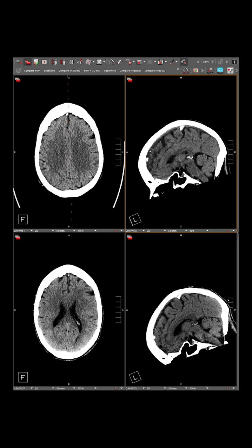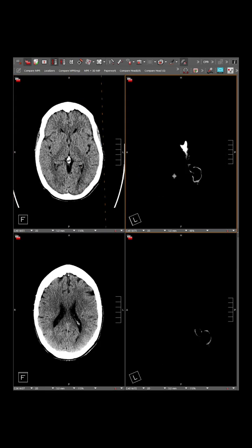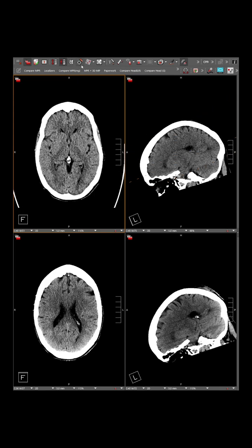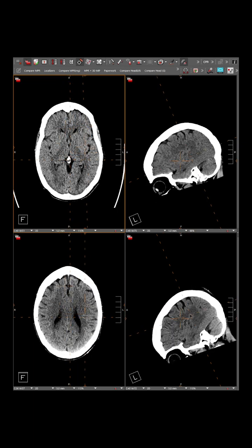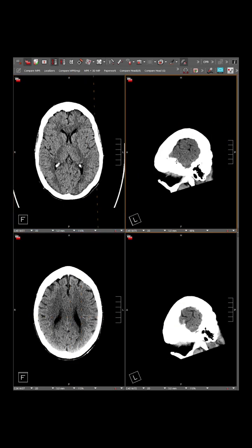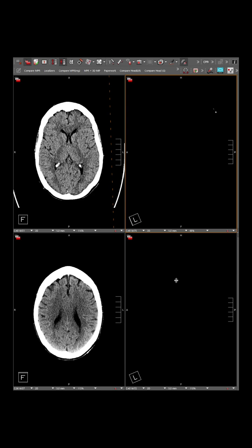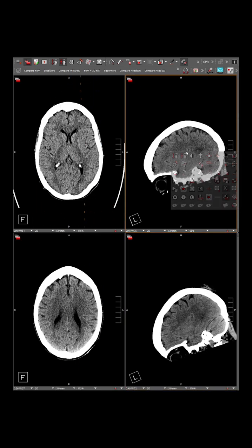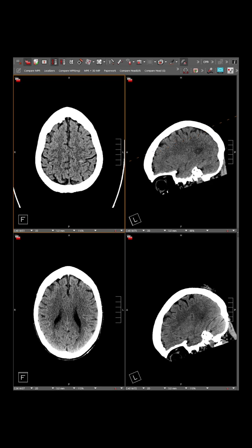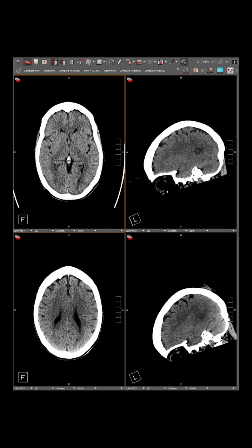Okay, so the most important thing is basic functions, right? You can change the function of the left click, we've got scroll here, you've got a continuous scroll, and you could localize, but it's much better to avoid having to click on a toolbar or even right click to switch tools. The preferred way is to use a single action, like a mouse key or a keyboard hotkey, to access everything. So scrolling, if you just keep it by default, you can keep it on the left mouse button.